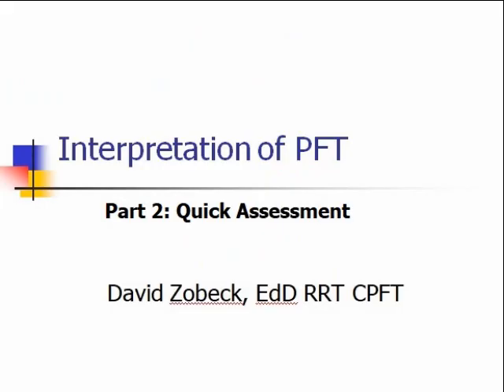In this interpretation of PFTs, hopefully you have watched Part 1, which covers the graphs and measurements. In this Part 2, I cover the shortcut on how to interpret these tests, these pulmonary function tests. And the shortcut version isn't perfect, but it sure will get you close to the accurate interpretation of this test. So let's move on and look at this information.